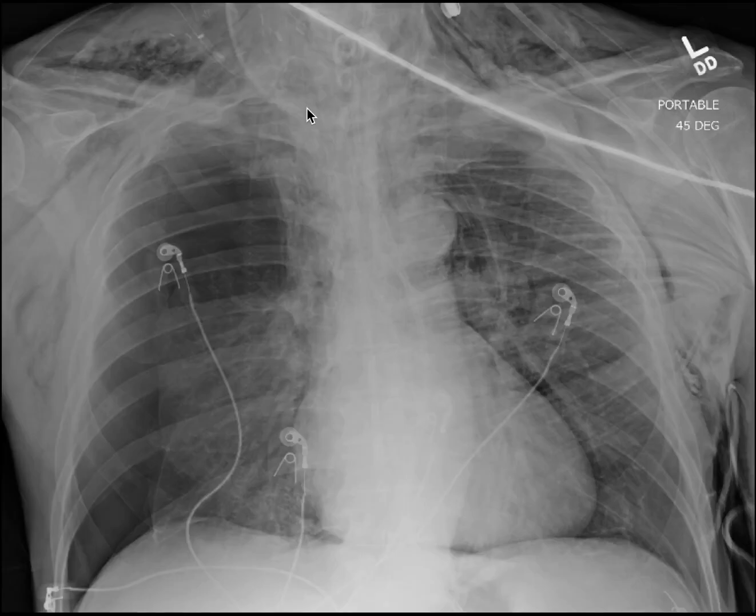But what was found at the end of it is something that is very rare, and you may just see case reports of this. There was what looked to be maybe a piece of soft tissue that was acting as a ball valve. And the effect of that is that the patient is allowed to breathe in, and it's open and patent, and the patient takes a deep breath.